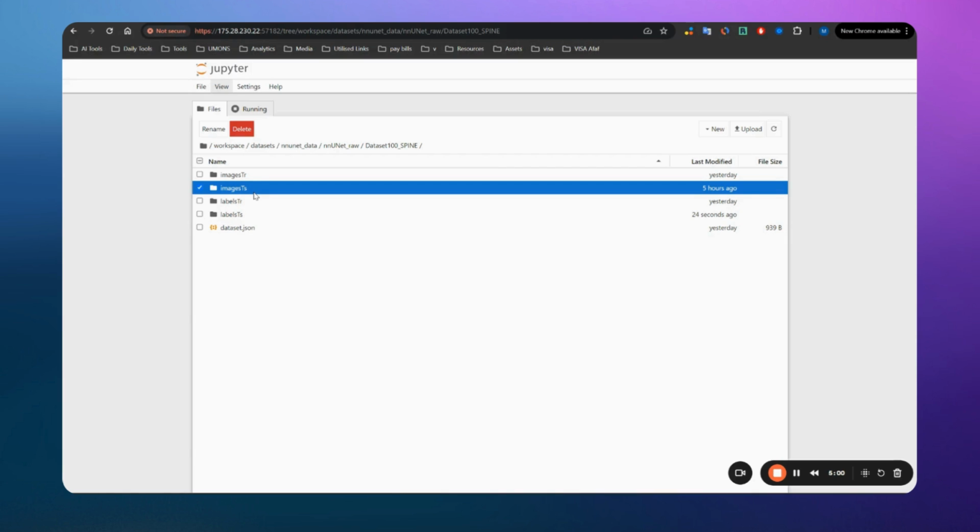Like neither for training nor for the validation. So these are really images or scans that haven't been used or seen by the model. So if we get good results or good metrics on these scans, this means that the model is working well for this kind of task.